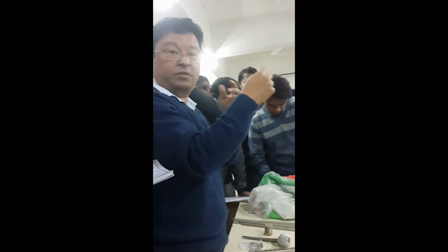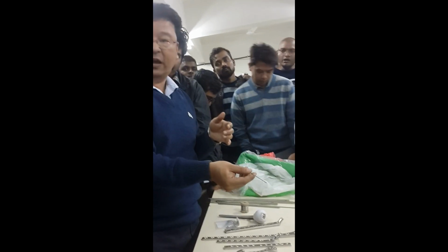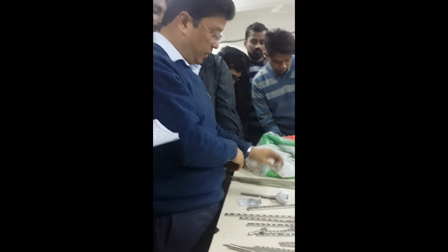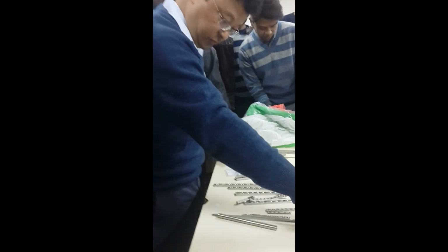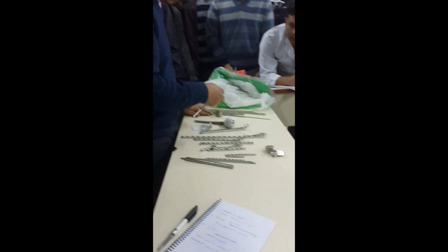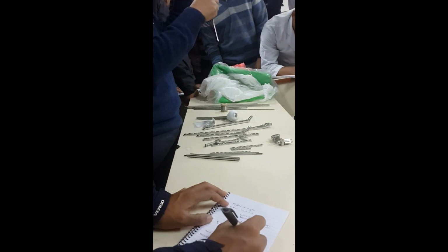But tension band can be done anywhere, even in the greater trochanter, on the side of the fragments, where you just put a K wire. Even in the malleolus fracture. There the principle does not work; it is just to hold the fracture fragment. So this is about K wire and stainless steel wire. And K wire has both ends pointed.